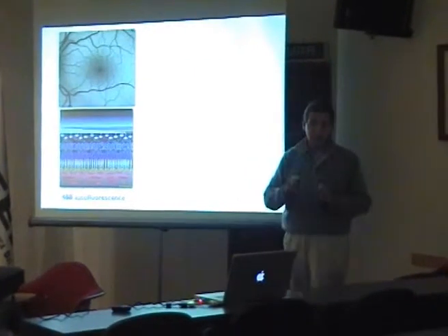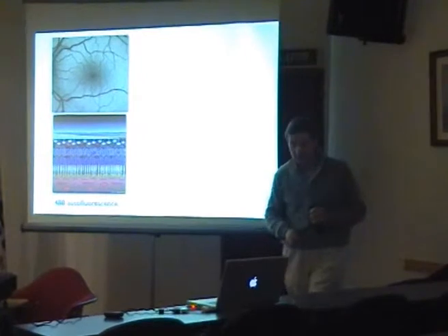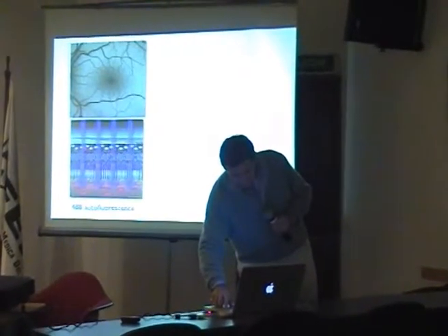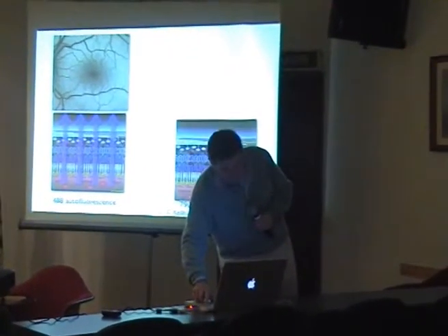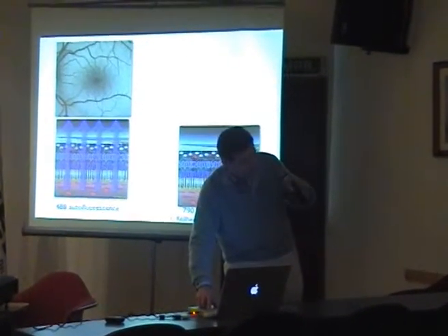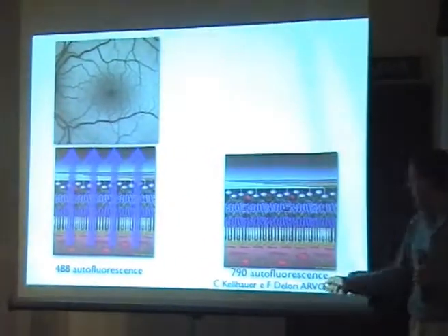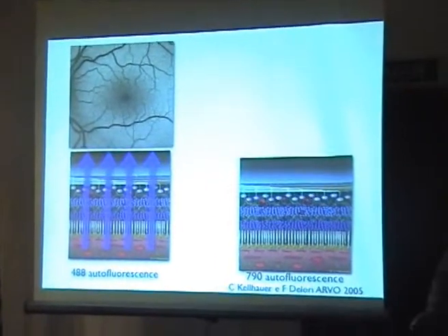So, until now we spoke about the 488 nanometer autofluorescence, with 488 nanometers for excitation and a barrier at 500 nanometers. But we also have the near infrared autofluorescence.